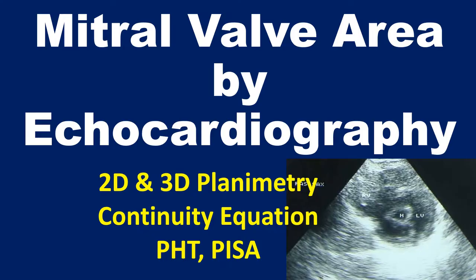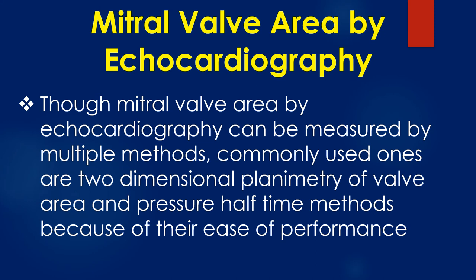This is a discussion on the assessment of mitral valve area by echocardiography using multiple methods. Though mitral valve area by echocardiography can be measured by multiple methods, commonly used ones are two-dimensional planimetry of valve area and pressure half-time methods because of their ease of performance.